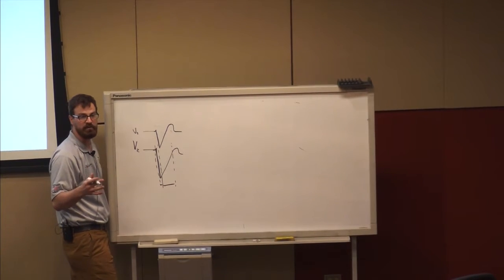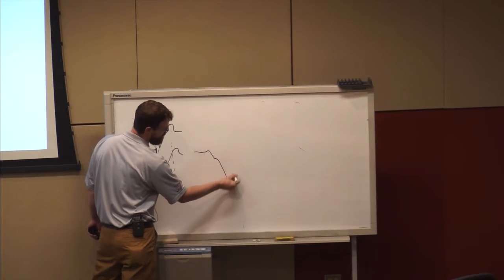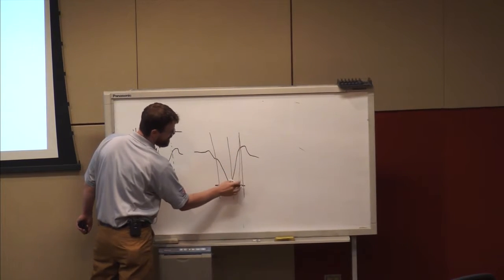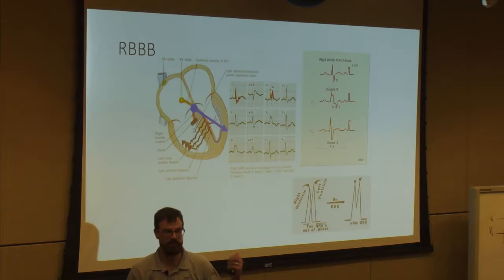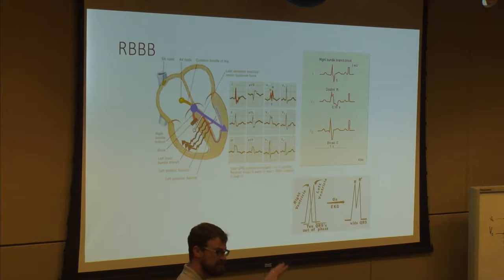But let's take a pure ventricular beat, like a PVC or a run of V-tach. What does that look like? Well, I typically have this slow notched down slope followed by a slow up slope. So when I split my event, it's slow on both sides. Does that make sense? So I'm only half slow with my bundle branch blocks, and you can tell that through your intrinsicoid deflection, as opposed to slow throughout, which tells me I've got a more pathologic state than just the bundle branch block. So that intrinsicoid deflection can tell you a lot about what you're dealing with.